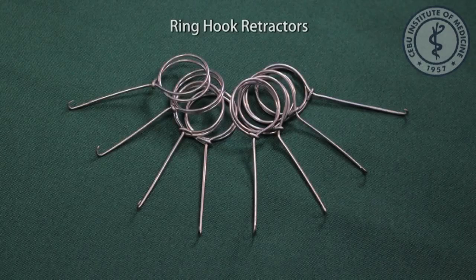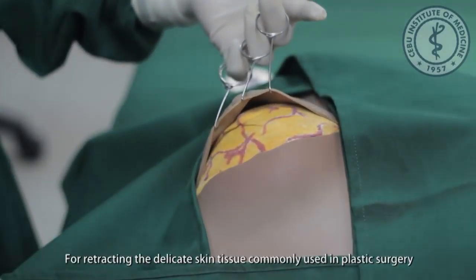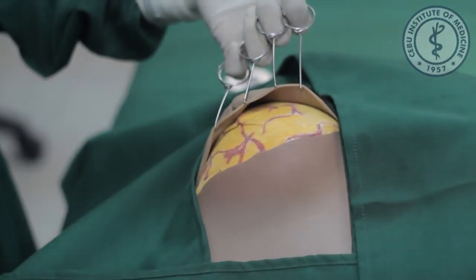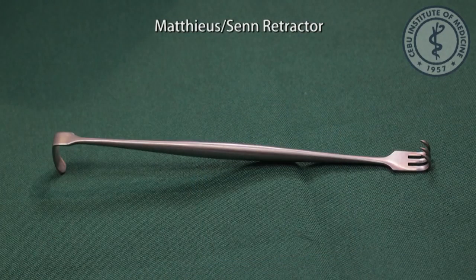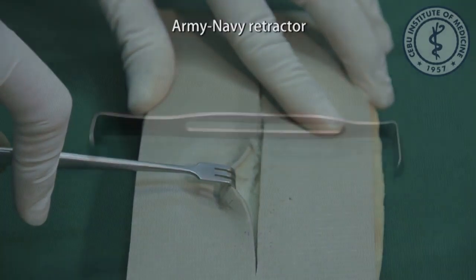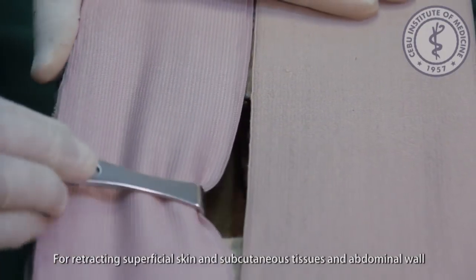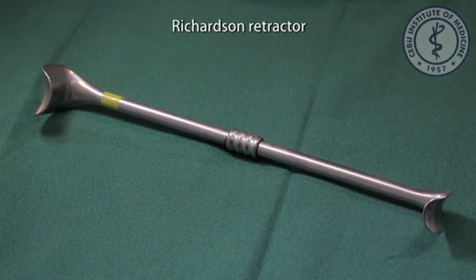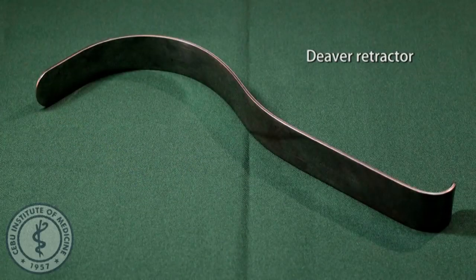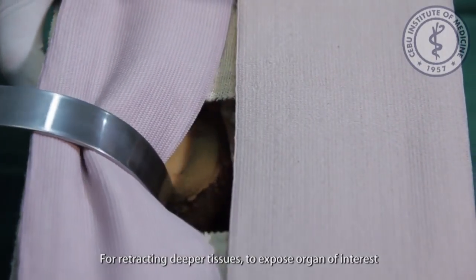Retractors. Ring hook retractors, for retracting delicate skin tissue, commonly used in plastic surgery. Senn retractor, for retracting superficial skin. Army-Navy retractor, for retracting superficial skin and subcutaneous tissues and abdominal wall. Richardson retractor, for retracting muscle tissue. Deaver retractor, for retracting deeper tissues to expose the organ of interest.